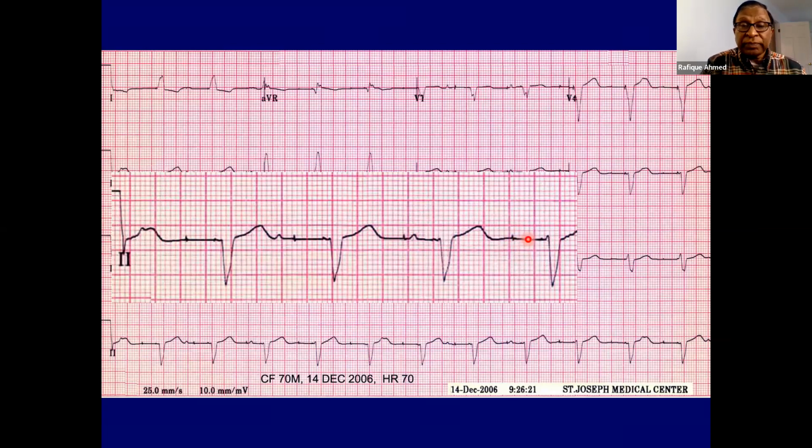Any questions from anybody? One question I have: if the P wave, like we call a blocked P wave, comes just immediately after the V complex, that might fall into the blanking period, right? And the atrium might not sense that. Okay, so what Aziz is mentioning is the blanking period. Now, the blanking period is designed to make the pacemaker blind for a very brief period of time, usually between 40 to 80 milliseconds, not more than that. So if that was true, it would have been over here. If it didn't see any P wave over here, it can be the blanking period or within the atrial refractory period. But this is way outside. This is about 400 milliseconds outside. So this is not in the blanking period time.